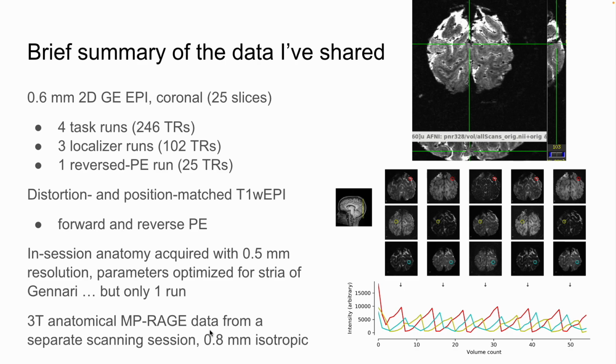So for the yellow voxel, I picked something that also looks kind of CSF-ish, and for this blue voxel, I picked something that was more in the tissue, and you can see that they had different, it's complicated. I can't just read those and tell you what the T1 was, but they each have different temporal profiles for the intensity because of the different inversion times. Does that make any sense at all?